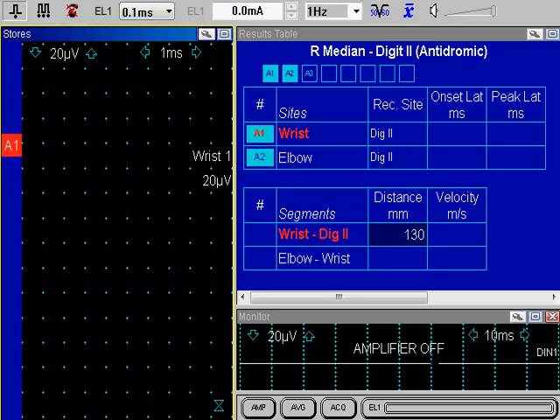The stimulator settings are shown at the top in the toolbar: the stimulus duration, stimulus intensity, and stimulation rate when a recurrent mode of stimulation is used. The stimulus intensity can also be seen in the status panel in the bottom right corner when we begin testing. Connect the recording electrodes to channel 1 input of the amplifier and turn on the amplifier if necessary.